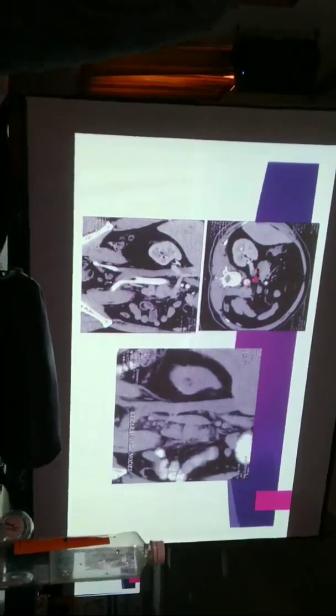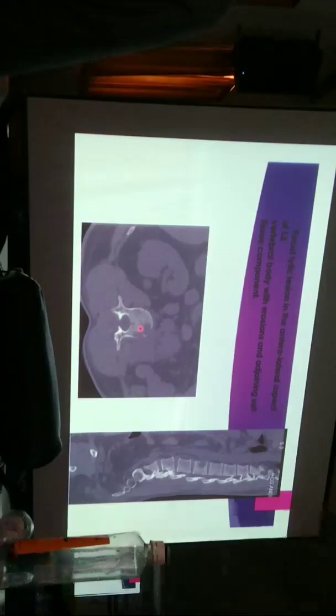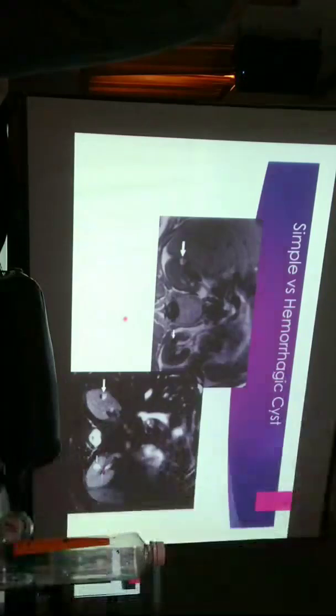This patient had a left nephrectomy done. The patient had multiple lymphadenopathy involving the left postoperative bed, and the CT scan also showed some bone metastasis. So CT scan is useful to follow up RCCs, and the corresponding PET image showed significant uptake in the lymph nodes, as well as a small left adrenal nodular lesion that was showing an uptake.